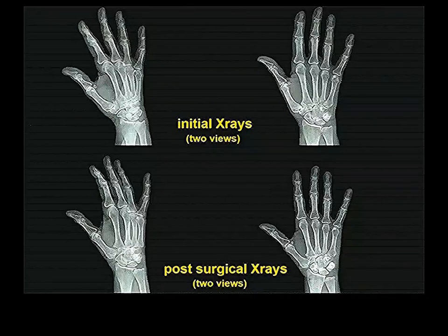Anything odd about what's going on here? Because all bones that form joints should be separated by a clear area, because the two bones contact one another with cartilaginous surfaces. All right? For example, here's the nice clear area between the scaphoid and the radius. Here's the clear area, black. By clear, I mean black. Between the lunate and the radius. All joints, the bony surfaces, should be separated by the cartilage which forms the contact surface.